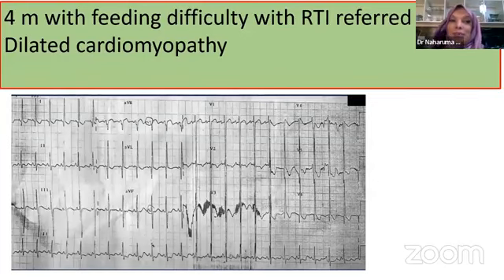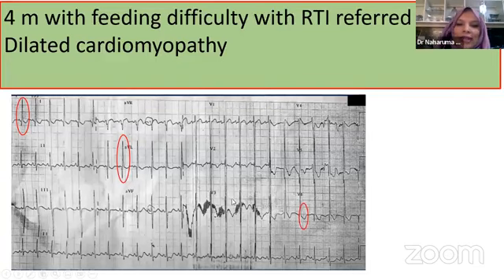And it is very important, I put it here because most patients come with an echo of dilated cardiomyopathy. If an echocardiographer misses something, the patient may be treated like viral myocarditis, but it will be a crime if we miss this on ECG. In this ECG we get a prominent Q wave in lead 1 and aVL, and also ST depression in V6. When an adult cardiologist finds this, they will say there is ischemia, and we know that coronary may be a cause. In a 4-month-old child, in small kids, can also develop coronary abnormalities.